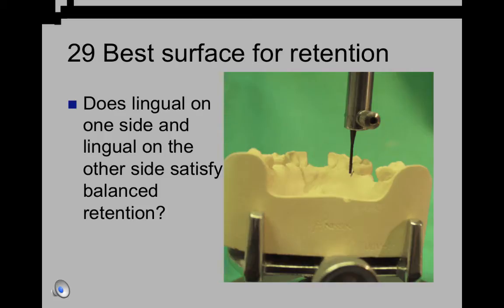So sometimes you have to cut retention in a tooth to get the undercut, and sometimes you have to crown a tooth to create the desired contours when you have problems like this. You do have to avoid perforating into the dentin when you prep an undercut on the tooth, because the patient would be very uncomfortable every time that arm moves and touches the dentin.